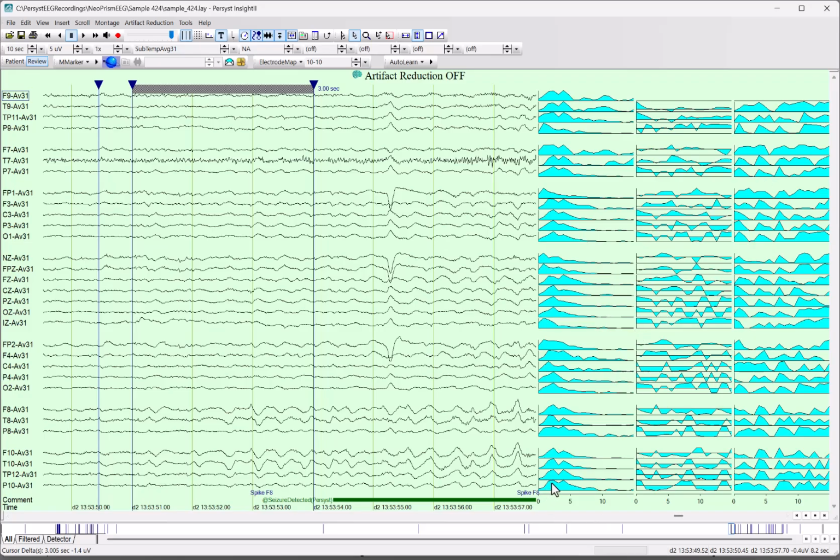And here are a couple of frequency peaks in this, here and here. Let's just visually assess this, and then we're going to apply a cursor to look at some numeric outputs from that. So at this frequency, this is roughly 2.5 Hertz. Then I can look here at roughly 2.5 Hertz and see what the relationship is. And that's something else I need to do. I didn't change the cross-correlation channel.